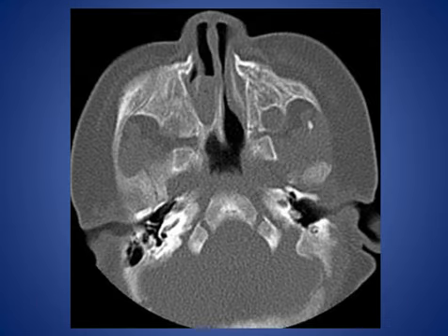Next case, this is a 1-year-old child with difficulty in breathing and upper respiratory tract infections. As we see here, the posterior nasal cavity is open on one side, and here it is closed with a bony component. This is called choanal atresia, bony type, and there is some secretion and collection proximal to the atretic part.